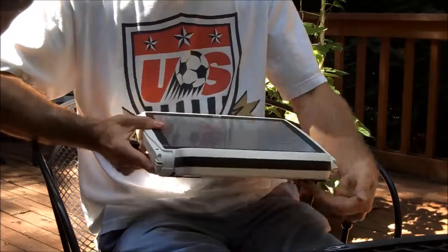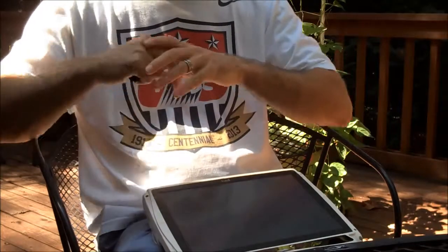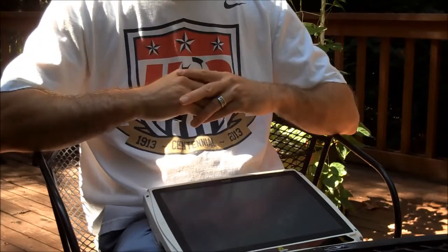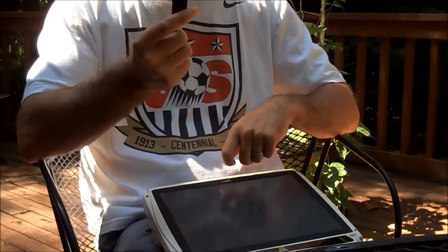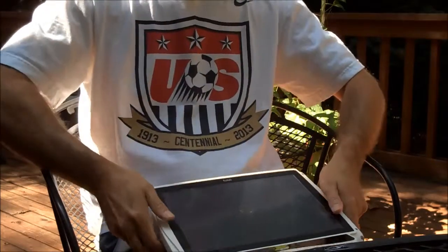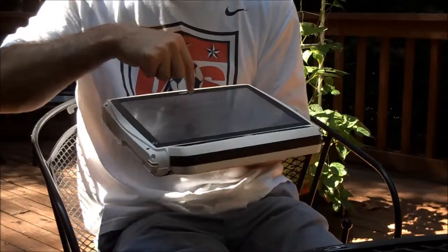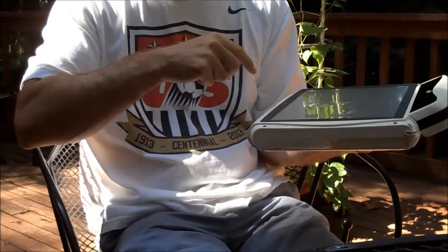Workflow number two is boot up the software on a second machine like a laptop, make your changes, make your additions, test it on your laptop for a little bit, get it the way you think it looks, take out your thumb drive, copy your changes onto that thumb drive, then go take the device away from the child, plug the thumb drive in, copy your changes off of your thumb drive locally, make sure everything looks good. If you have to make edits, then give it back to the child.